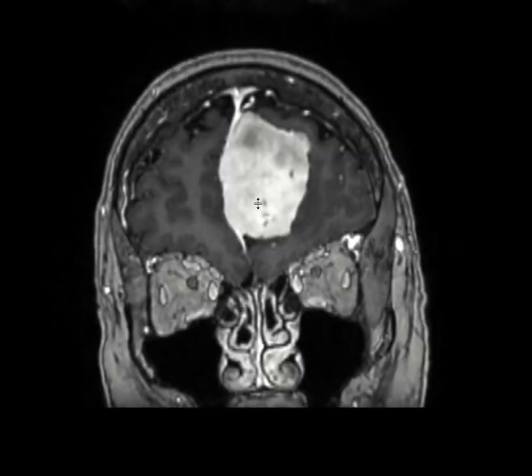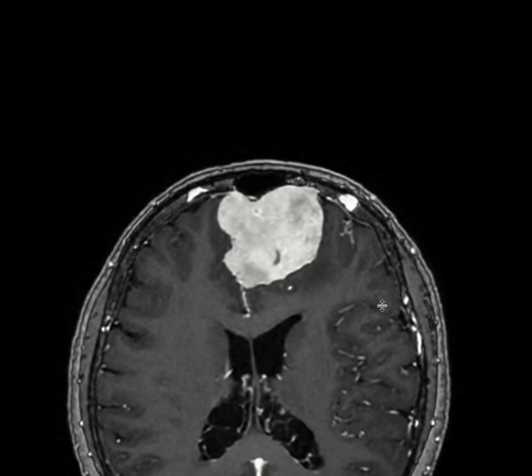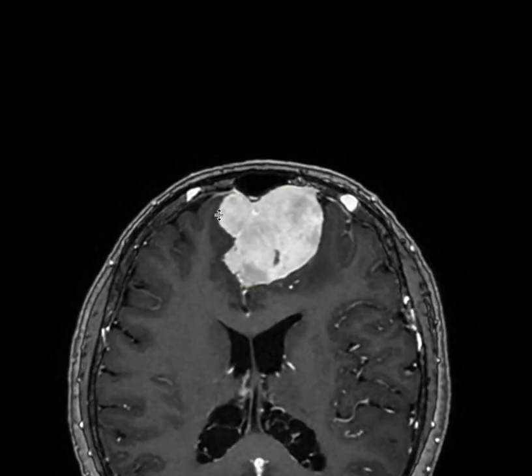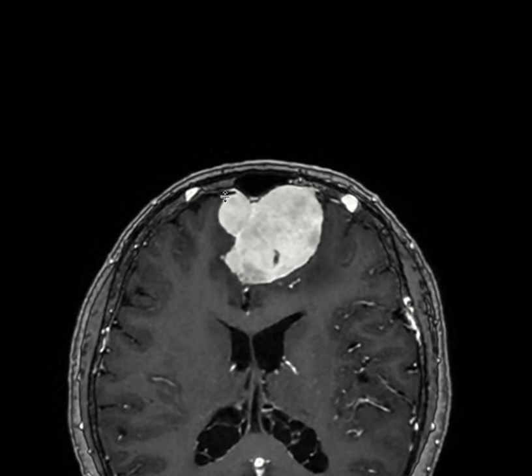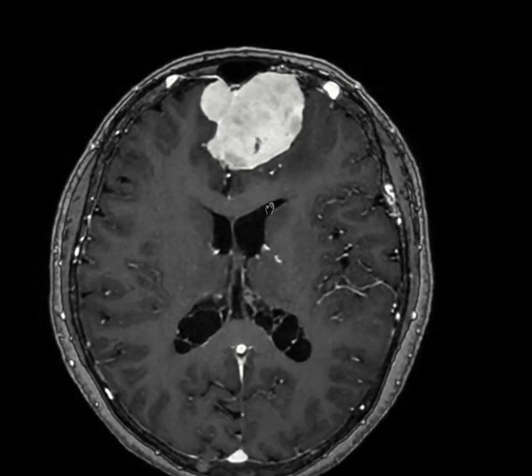The other sign that helps us know if the lesion is intra-axial or extra-axial is a dural tail. If you look at this lesion closely, you see some dural tail or enhancement going into the adjacent dura. Right here, this is small, you see this tail over here and this tail over here that just connect this mass to the adjacent dura. That is also another feature of an extra-axial mass.